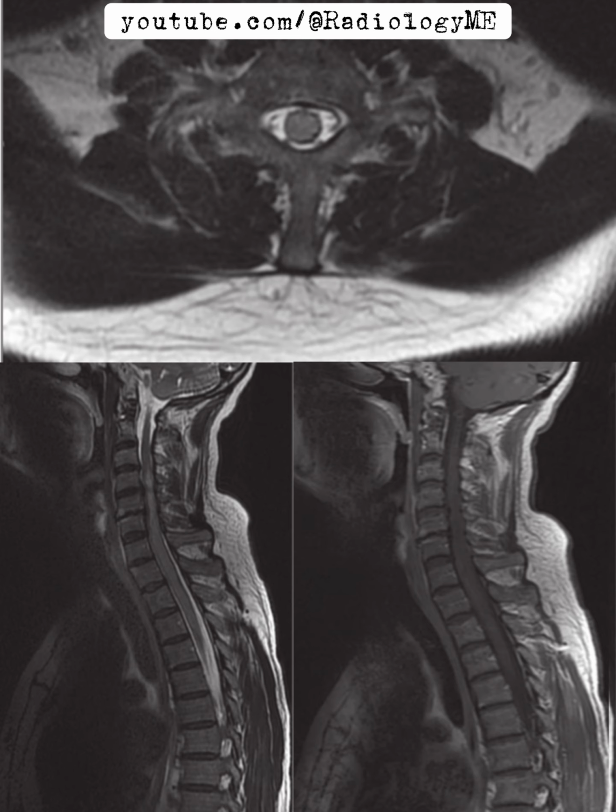But let's pivot and consider the possibility of a more acute presentation. Here's where my focus really sharpens on spinal cord infarction. The high signal on T2 and the lack of enhancement are strongly suggestive of this. Another key point is the absence of trauma history, so while a hematoma could be another consideration, it becomes less likely here.